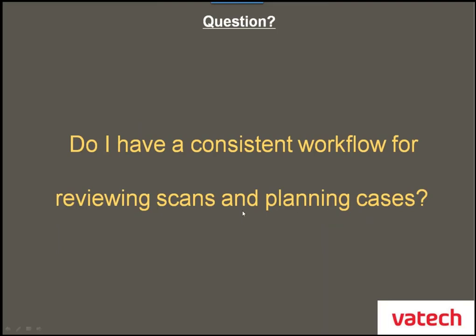One question I would like everybody to ask themselves throughout this series is, do you have a consistent workflow for your scan? So when you sit down to look at your scans through Vatech software or other third-party software, what we're trying to establish is an easy path for you to do your workup of your cases. When you get back to the office, we can scroll through our scans. Same thing for each clinical application. So think about that as we go through our session here today.